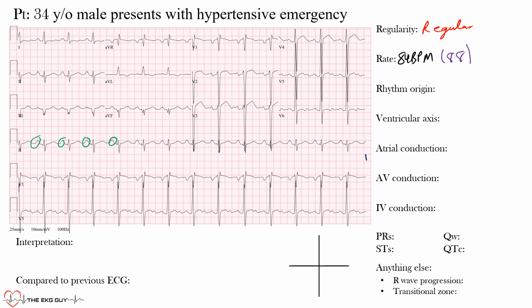All right. Normally the machine only gives you the ventricular rate, but as we know, these machines are notoriously poor. We're doing a lot of artificial intelligence research, and we're showing that a lot of the AI stuff that we're developing is really outperforming it, and we'll have a few of those articles coming out soon, so stay tuned. AI is likely the future of EKG interpretation. So anyways, back to what we're doing here.